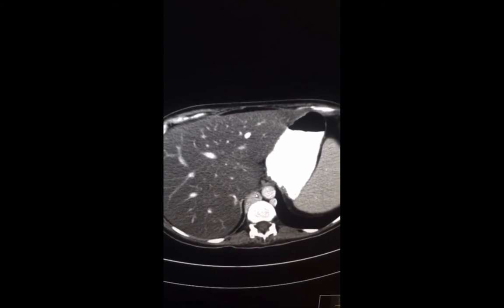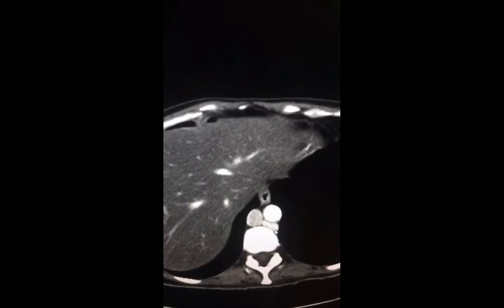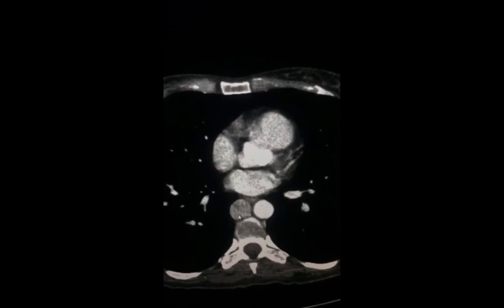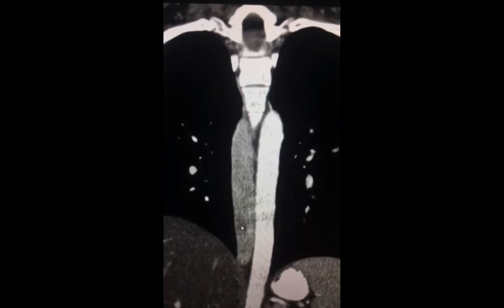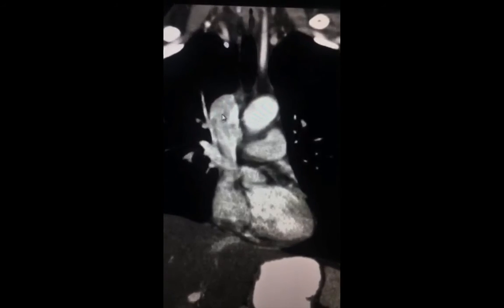Now, looking at the CT scan of this patient, you'll notice that the patient does not have an IVC and he has this distended azygous. And this is the distended hemiazygous joining the azygous on the right side. And now this hugely dilated azygous assumes its normal course to go all the way superiorly and curves above the right bronchus to join a distended SVC as well. And this is a coronal image on this abnormal patient showing this huge azygos that's almost equal in size to the aorta, which curves at the right tracheobronchial angle to join the SVC.